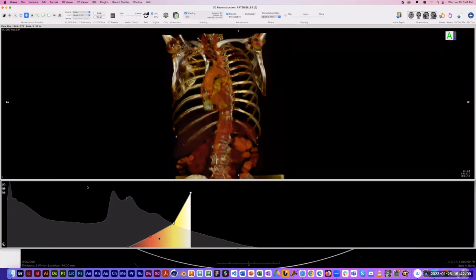I explained this Monday in my lecture. Let me go back over this. There are two different graphs that are visible here. In the background, there's a gray graph or gray histogram.